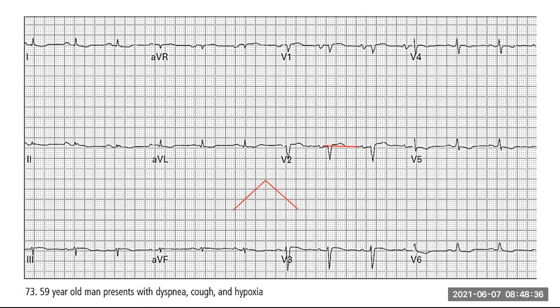The second part of your P wave is your left atrium, all right? Now, we're going into a little bit more depth, but just so that you understand how it works. When you are assessing the P wave, the first half of it tells you a lot about the right atrium, how the right atrium is functioning. So is it a steep uptake? Is it a slow uptake? Is it very peaked? Is it not peaked? There's a lot that you can pick out from it. And then the second half tells you about the left part of the atrium, all right?